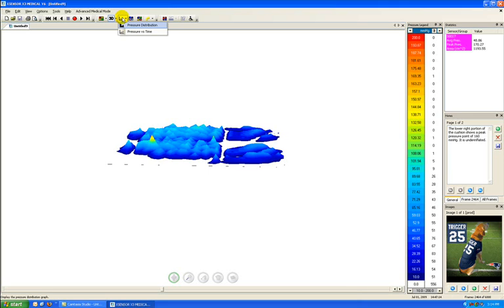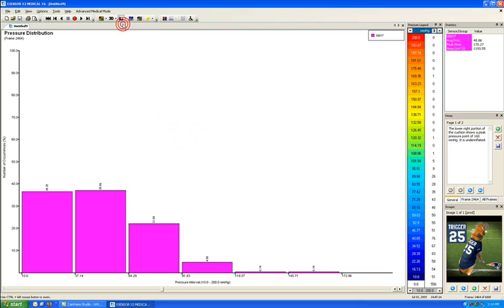Moving down the line, we have some very useful graphs. So I'll start with the pressure distribution graph. Here we can see the percentage of values that fall within a certain pressure range. So let me show you an example. In the first column we have 36.35% of values falling within 10 and 37.14 millimeters of mercury. So that's telling us that at this particular frame, 36.35% of values fell within that pressure range, over the 1296 sensing points on the sensor.